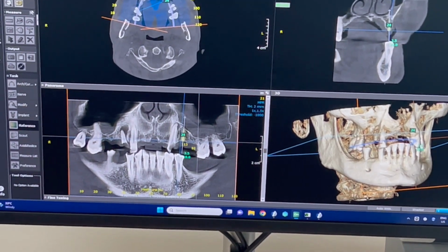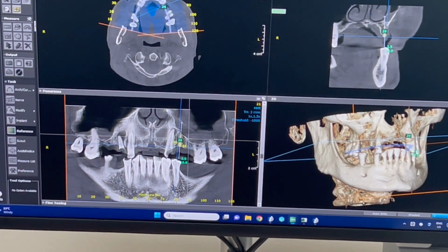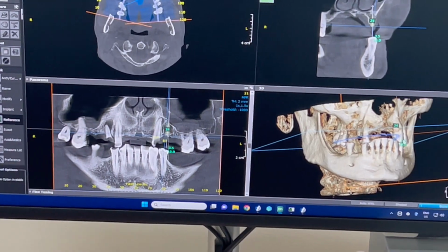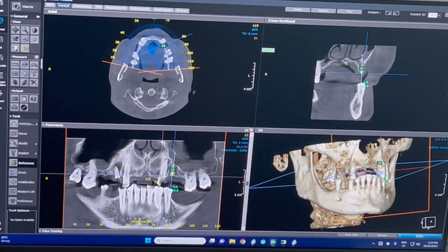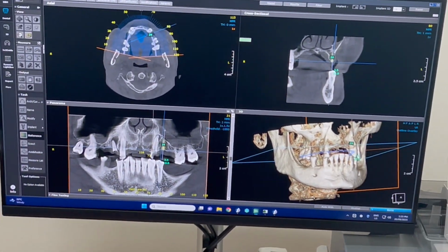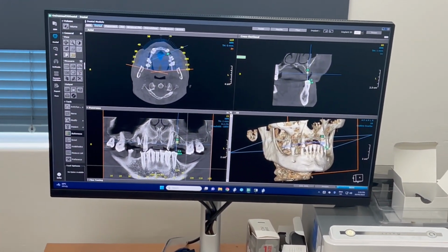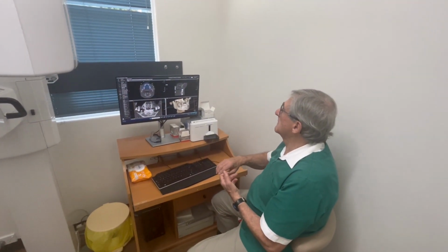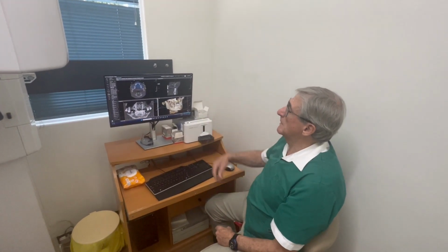Once you've healed up in 6-12 months, if you wish to go ahead with more involved treatment with an implant on this upper denture, I can show him this with the new scan. If you want to just put clips on 2 canine implants, or you can do it all on 4 or 5, either way you can demonstrate to the patient exactly how much bone they've got and whether it's plausible, and work out a price from there. Obviously the lower is another challenge, but very rapidly: perio, prosthetics, caries, restorative work, implant work, one image.